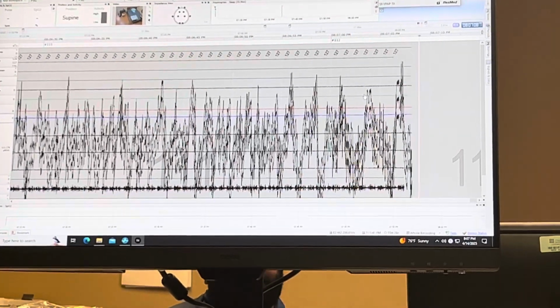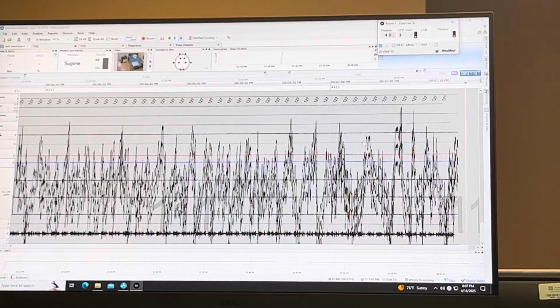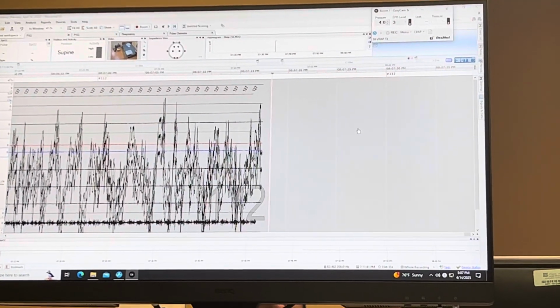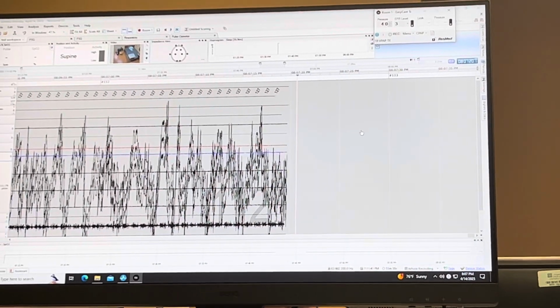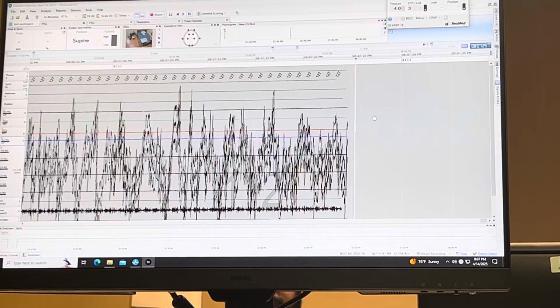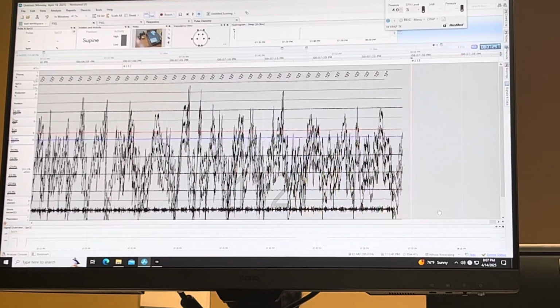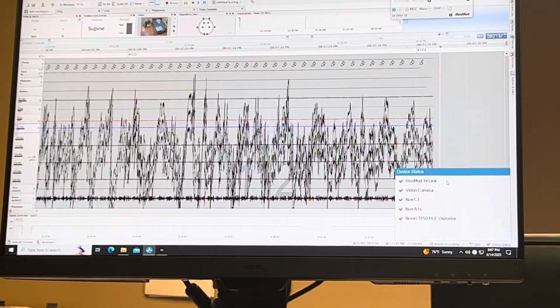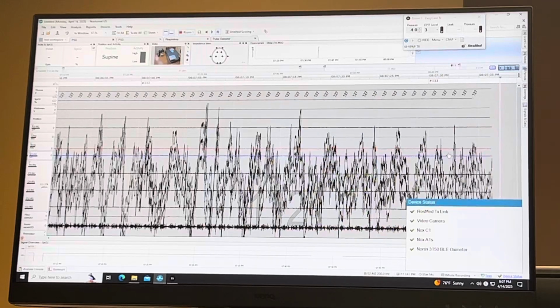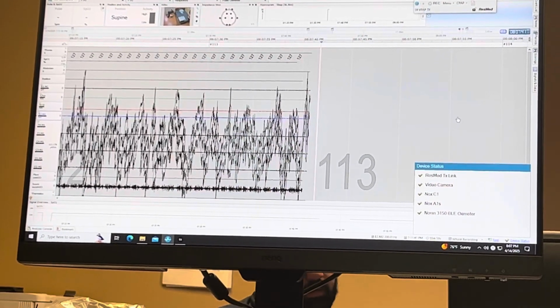Your PAP duration is going to match the total reporting time, not from the time you've turned it on. The TX Link is a bit of a bully, which is why we don't want to turn it on until you're ready to use it. You can have it pulled up, that's fine, you just don't want to connect to it until you're ready to. As soon as you connect to it, it knows it's connected and it's going to start pulling that information even if it's not turned on.